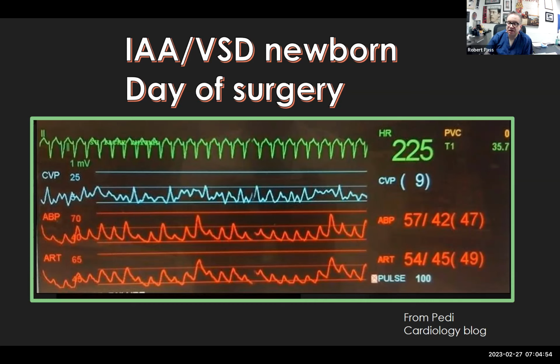The other thing is that on the blood pressure monitor, we see a lot of variability in the blood pressure, again, consistent with different degrees of filling of the ventricle with different blood pressures. So this is all suggestive of probably JET, as you said, but it could be VT as well. It could be either really, but probably is JET.